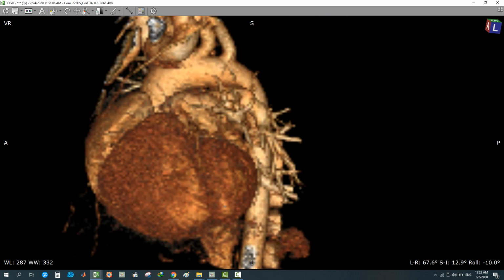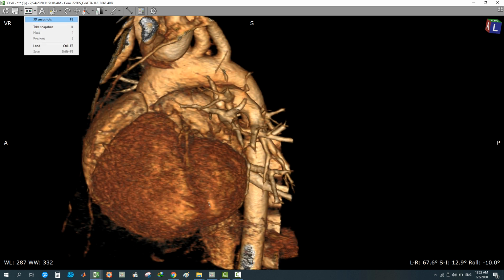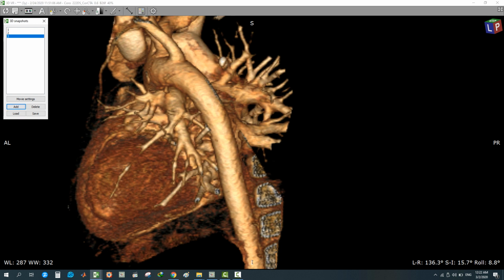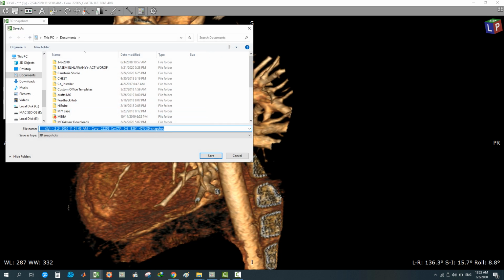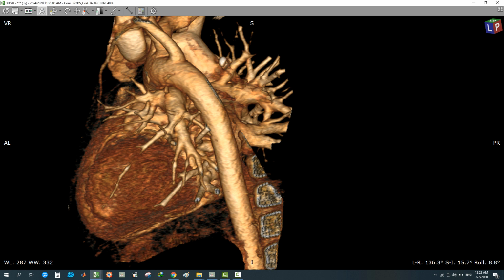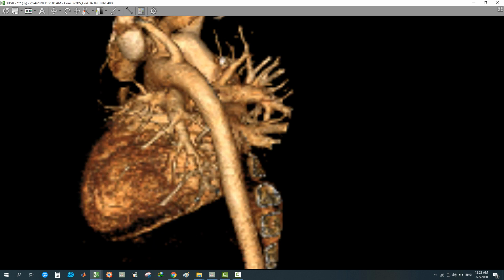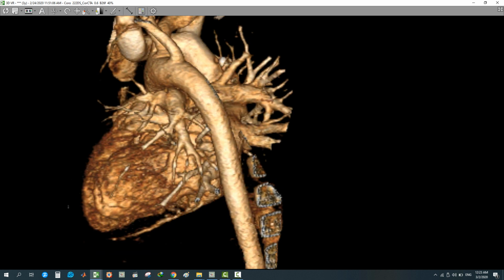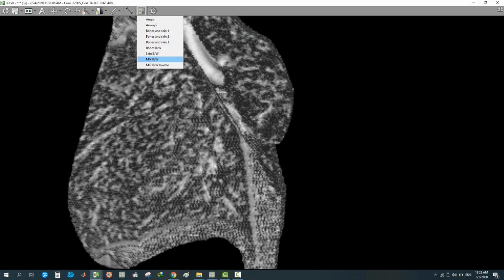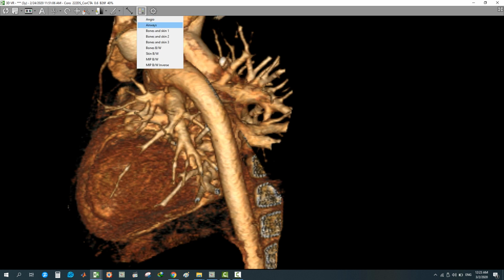And you can snapshot these images. You can see snapshot, 3D snapshot, add snapshot, this one, add snapshot, this one, or save, in documents or in desktop like this, new folder 10, save. Or even you can use, I think, this one, change the color densities. You want it more dense, more white, more brilliant, or like this. And the format of the plates, I think like this one. Otherwise, no, better.